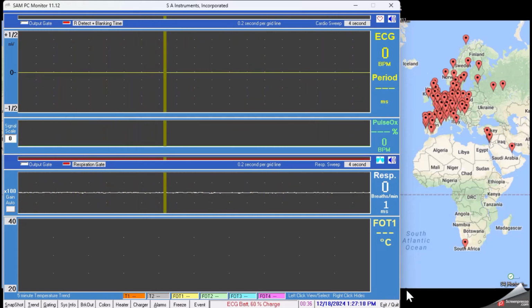When the snapshot key in the lower left is pressed, 36 seconds of all previously measured data is written to a snapshot data file. This snapshot feature gives us an excellent way of making training videos without the need to sedate an animal. We will use SnapView to play back snapshot data files previously collected with an animal in an MR scanner. Snapshot and SnapView are covered in detail in a separate video. Here we're just going to use SnapView as a training tool.